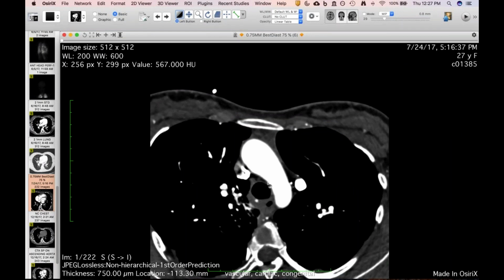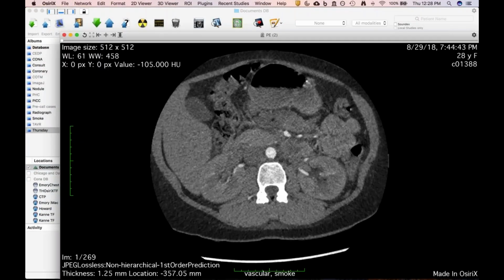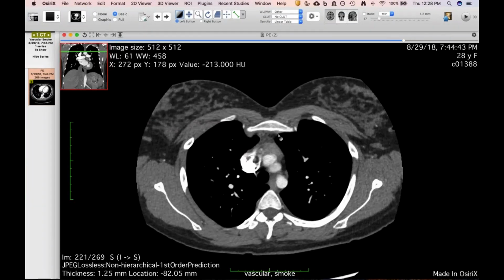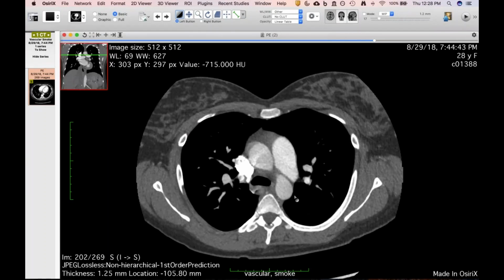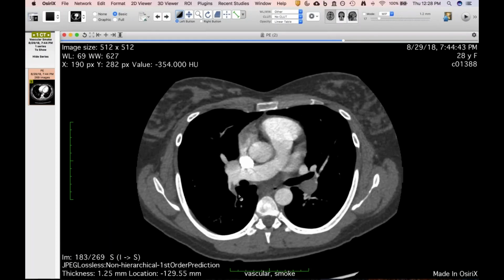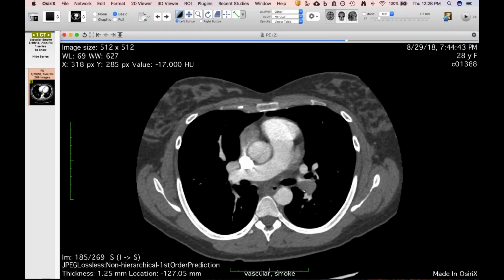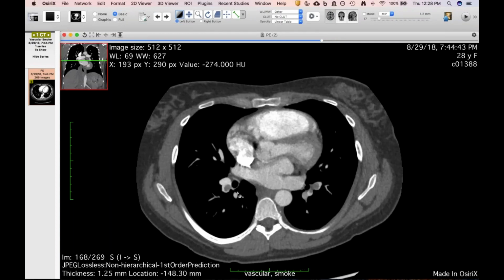Right. All right, this is one from this morning. I'm curious, I want everybody's opinion on this along the pulmonary embolism theme. So this is a woman who just gave birth a couple days ago and then developed dyspnea postpartum, and not a diagnostic dilemma, she's got pretty substantial pulmonary emboli bilaterally. You can see this large filling defect in her left pulmonary artery. She's got others on the right and in the left upper lobe.